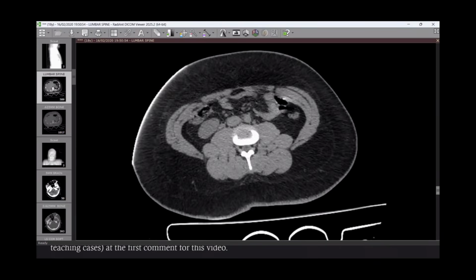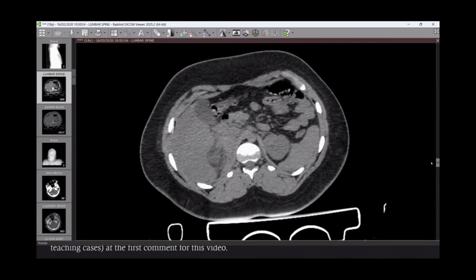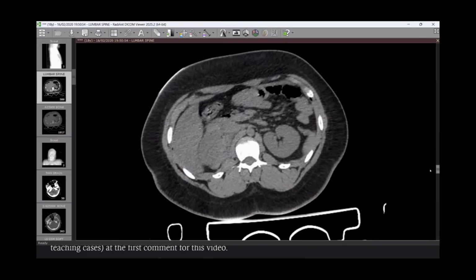It's not really in the hepatorenal. Hepatorenal is clear. This is in the retroperitoneal. It is retroperitoneal, totally agree. Yes, in the right renal pouch. Give me more location. What are the spaces in the retroperitoneum? Do you know? Pararenal and perirenal. Okay, but it's not going to the retrorenal space.